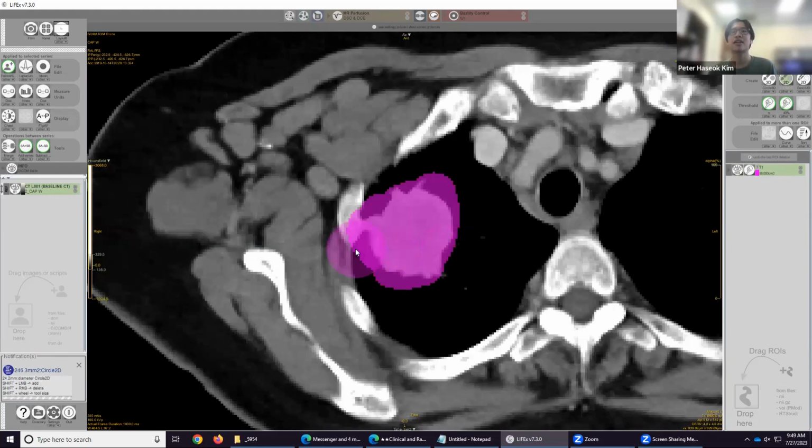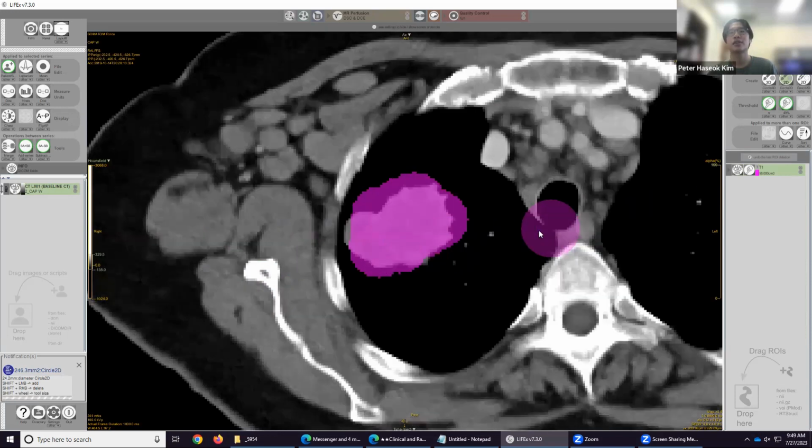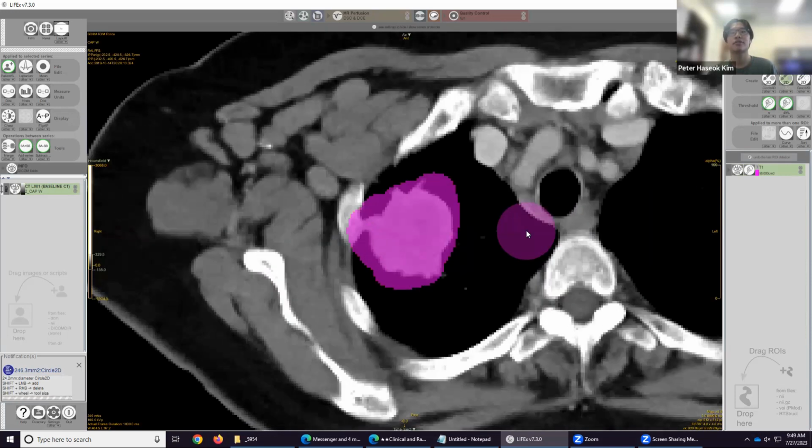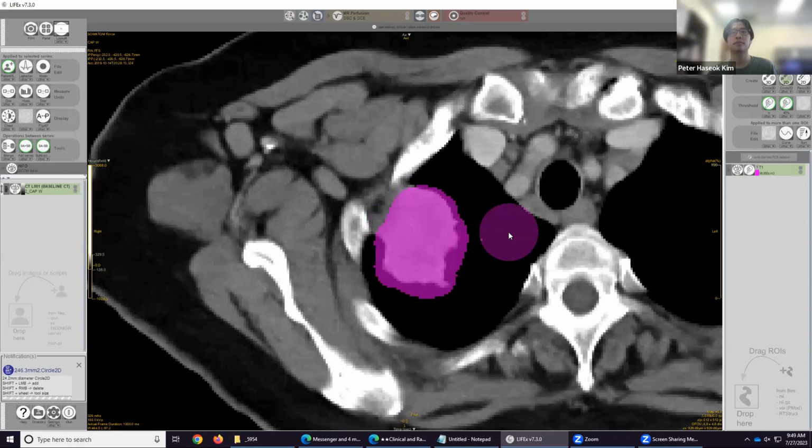And so as you can see, I Control slid, and so everything got shifted. I'm just going to try to adjust. There we go. Perfect.